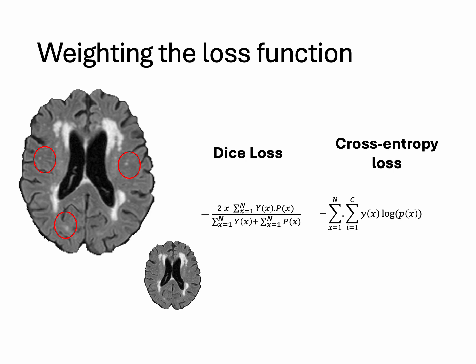So here the main idea is, you can see the white matter lesions which are closer to the ventricles, and there are a few small lesions which are shown by red circles here. These are very small in size, and they are completely overshadowed by these large lesions, because any segmentation algorithm we train gets a lot of instances for training from these periventricular lesions, and hence the algorithms do exceptionally well in identifying these lesions that are closer to ventricles, which are more predominant.